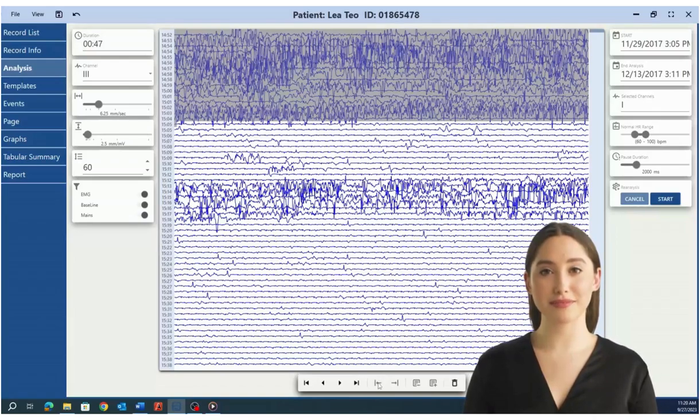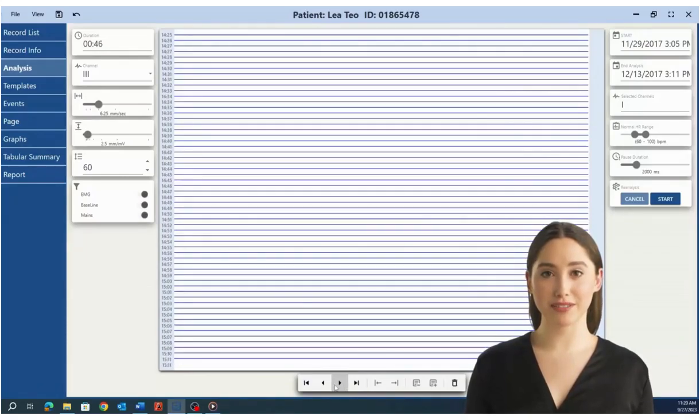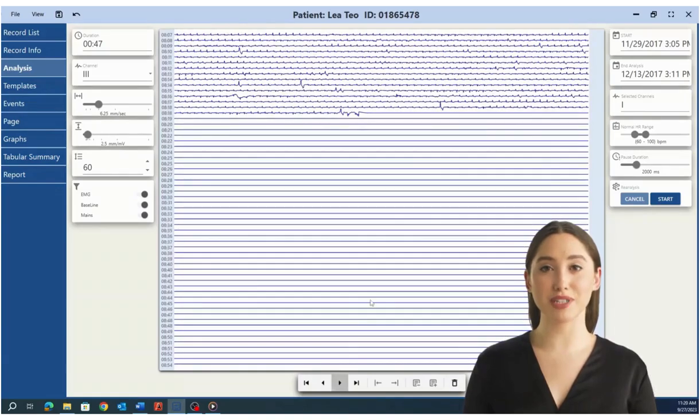action bar. Navigate to the final page. Click Final Page in the action bar. If the page displays noise, use the Page Up button and alternate channels to find a clear signal. Once a clear signal is located, mark this as the end point for the analysis.